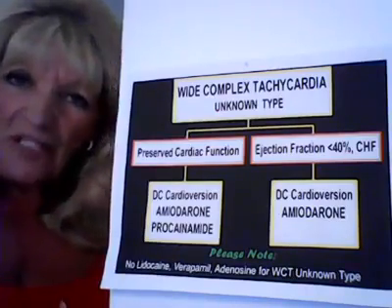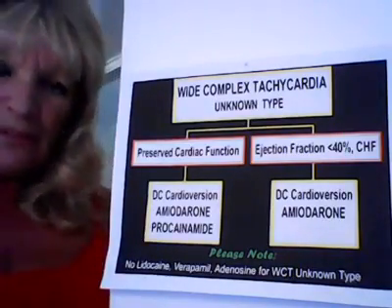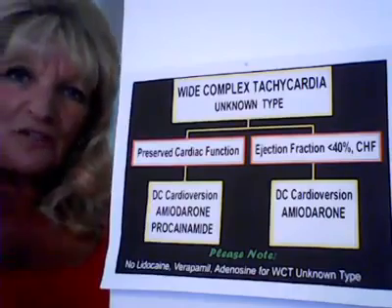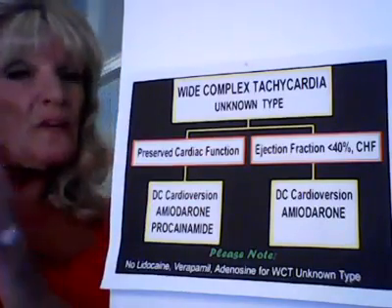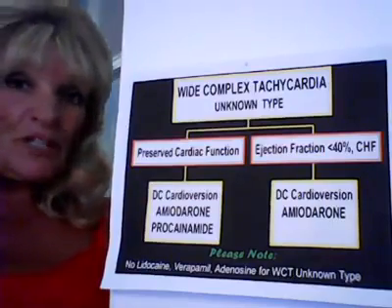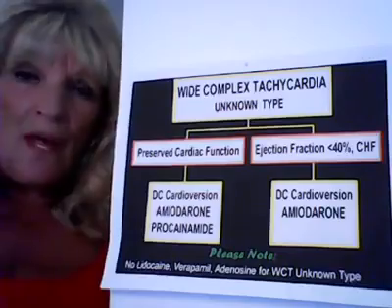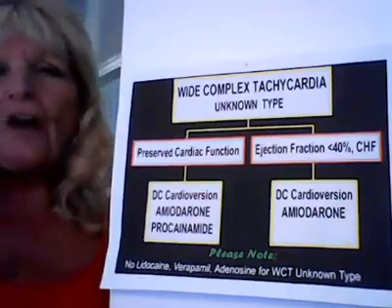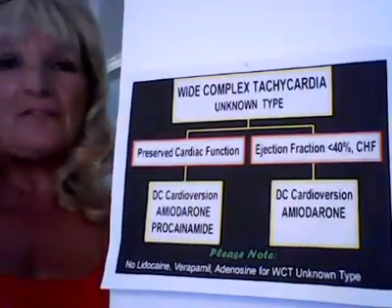Because that wide complex tachycardia can either be SVT with a right bundle branch block, where you'll see little mountain, little problem, or it could be SVT with a left bundle branch block, where you'll look at V1 and it's a very narrow R wave, or V2, and of course you're up in V6, or it could be VTAC from the left ventricle or VTAC from the right ventricle.